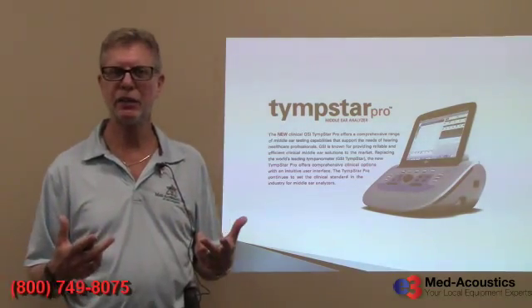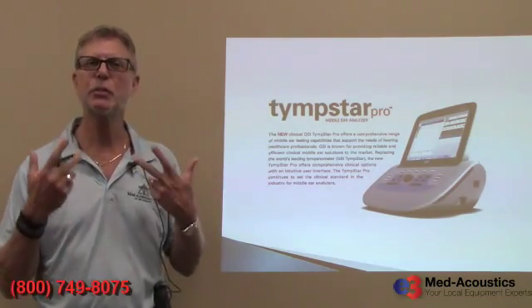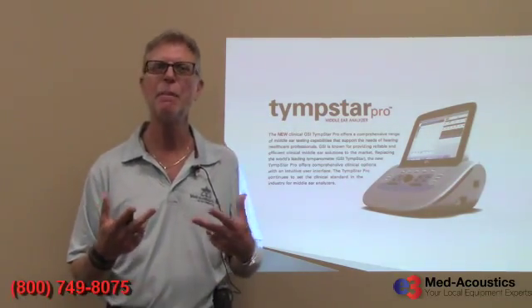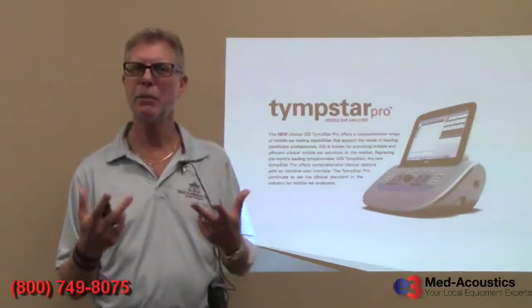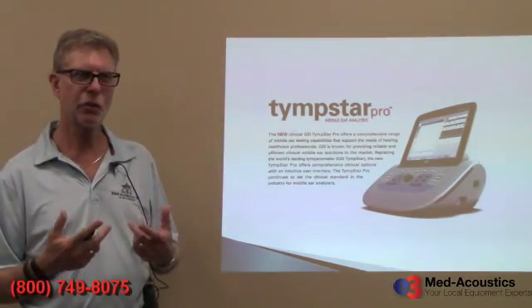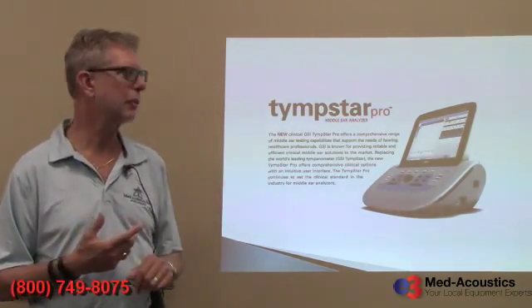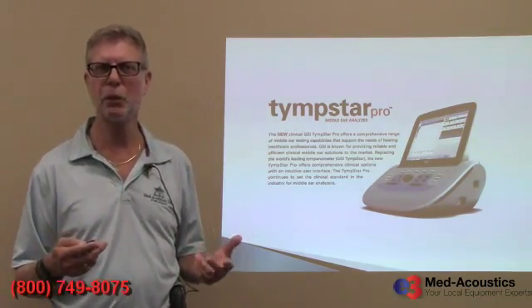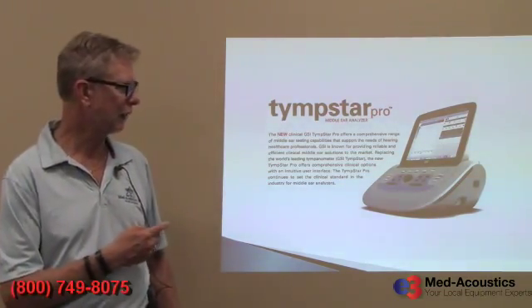When this was designed, we told engineering that there are two things that are very, very necessary. Speed is very important because many times these things are used on a pediatric population, and speed is of the essence. Another thing that's important is noise immunity, right? The patient might not be 100% cooperative, and the ability to use it remotely, control it from the actual patient's side instead of having to reach over to the instrument. It even has a touch screen on it too. And it's completely compatible with electronic medical records. So we'll talk about the features of these types of units, middle ear analyzers.